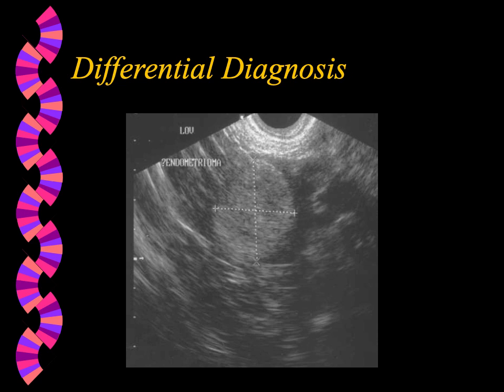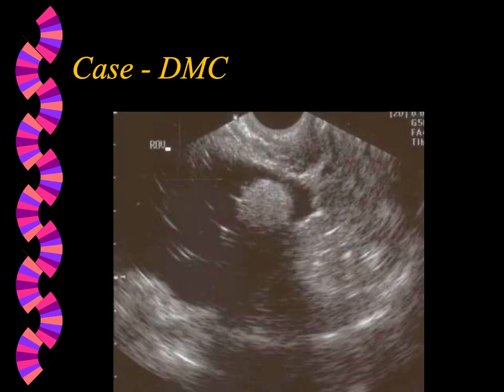The area that is marked is actually hair, which is coming from the ectodermal layer of the dermoid cyst. And when we look at her other ovary, we see another collection of hair, which again is from the ectodermal layer of the dermoid cyst. So these will not regress on their own, and we took this patient to surgery.